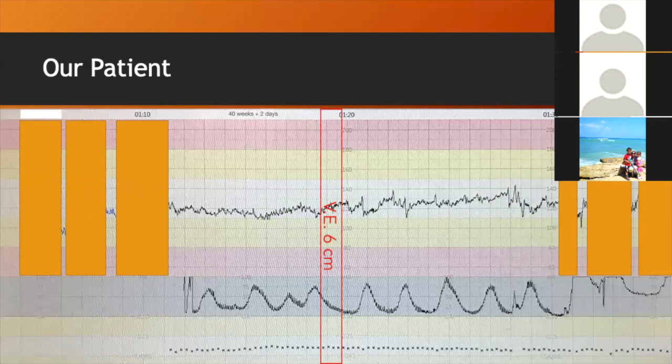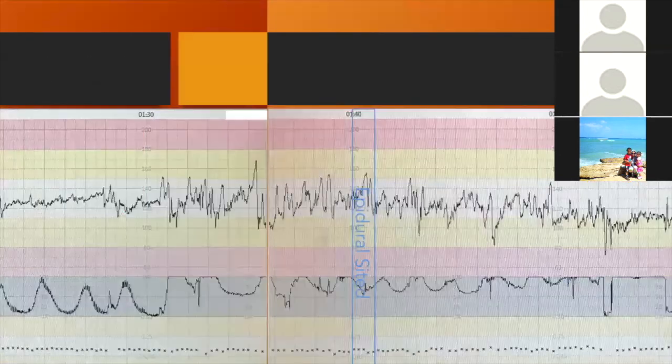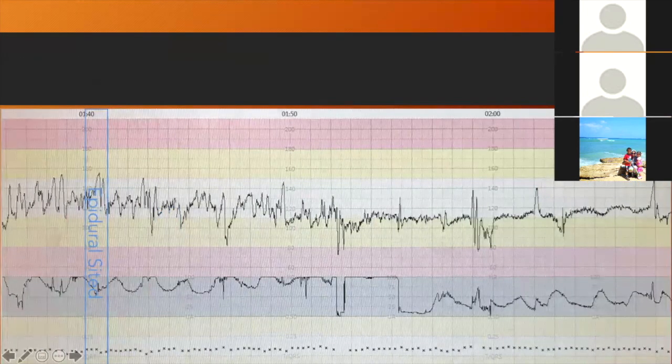If I have less than 50%, I am heading towards subacute hypoxia. If I have less than 30% or 1/3, this baby is becoming compromised. Even if the baseline is still stable, yes, baby has a lot of reserve, but it is becoming compromised. Okay? That is pretty much what we used to say. That was the definition of subacute hypoxia. So 2 to 1. Okay, and if you look a little bit closer, you can see that the baby is cycling.